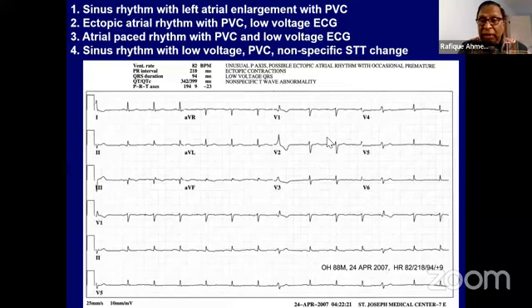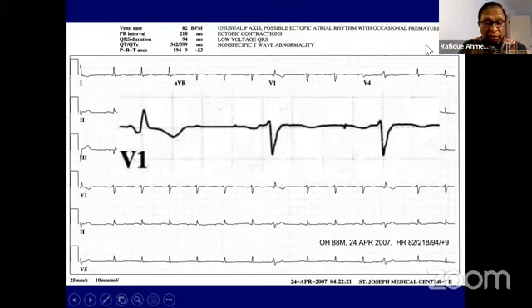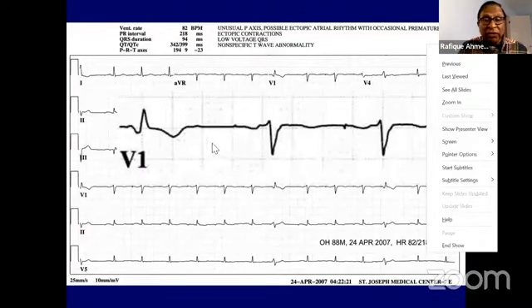But if you look at this, I have enlarged this ECG. You can see where my pointer is in V1, there is a small pacing spike. A lot of the new bipolar pacemakers have that problem, that the pacing spike is very small. So I've enlarged lead V1. When I magnify lead V1, you can see the pacing spike much more clearly. So you have to pay meticulous attention.